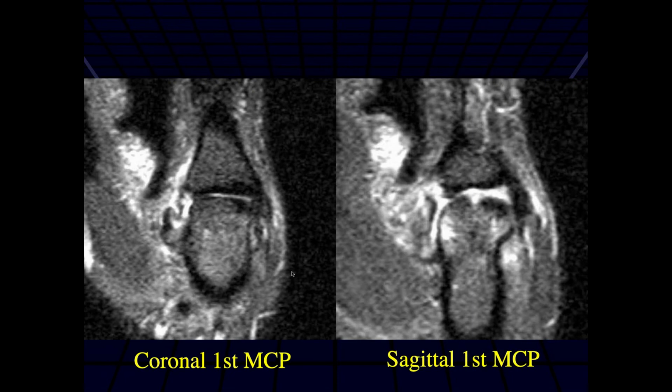Ashley, what do you think of this? I think this is actually a partial avulsion of the ulnar collateral ligament distally, and you can see that it's displaced, kind of abutting the adductor aponeurosis, I think, along the ulnar side. But you can see that there's some other injuries here as well.